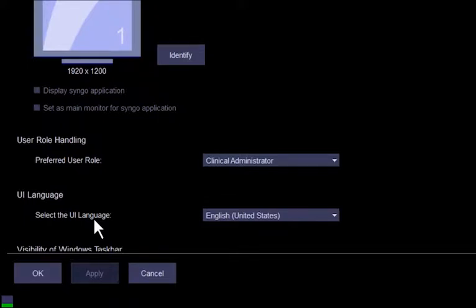Currently, the languages supported are English, German, French, Spanish, Chinese, and Japanese. There aren't differences in the interface upon local language variations. Changing the language requires a client restart, but the option will be kept as user preference.